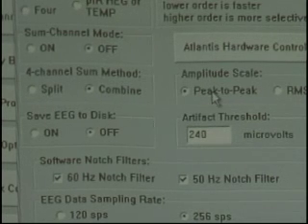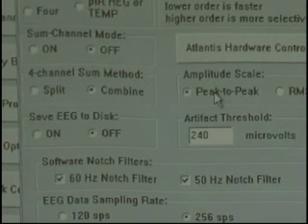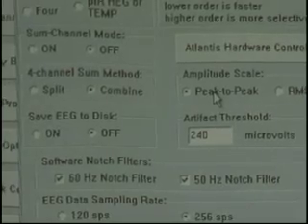As we then drop over to the right here, we have amplitude scale, peak and RMS. Basically, this is something that shortly will disappear. The reason we had the option here of peak and RMS is that 6 years ago or so, we had a software version called 1.9, and before that 1.8 and 1.7. All three of those software packages were measured with RMS, which is root mean squared. The problem with RMS is it tends to have low amplitudes in the higher frequencies.